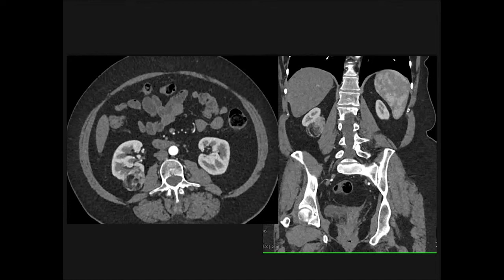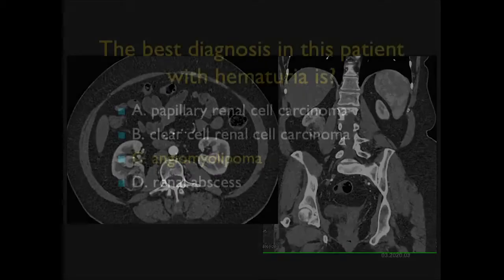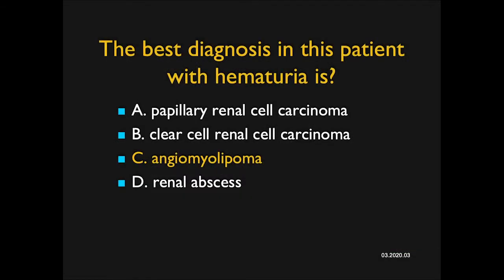You can ask the question, well, I once heard of a patient who had a renal cell with fat in it, but typically those are large clear cells with invading of the perirenal fat. This is well-defined, exophytic, a renal angiomyolipoma. Just a very nice example.